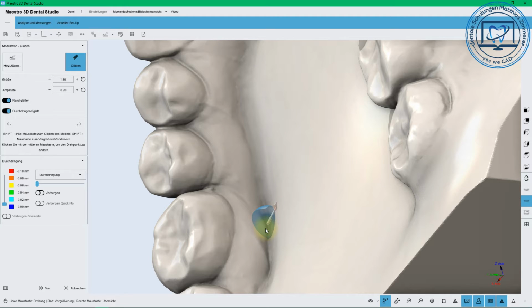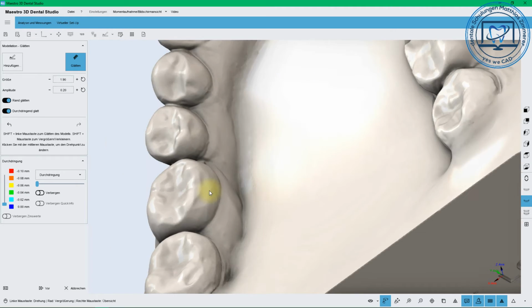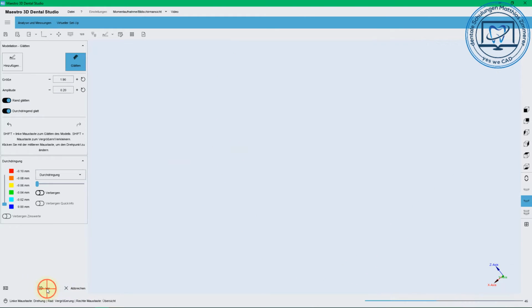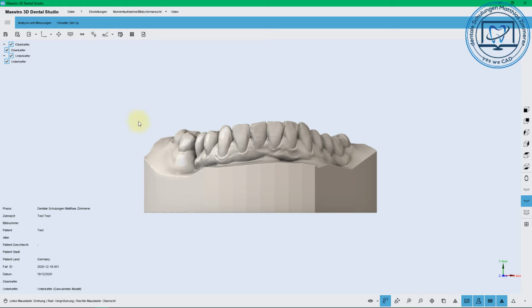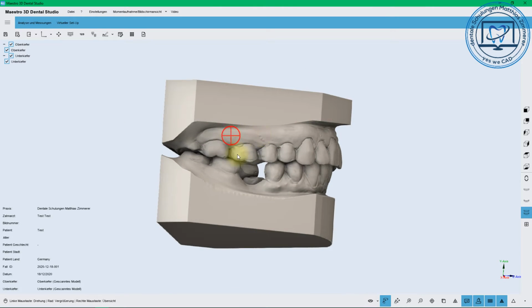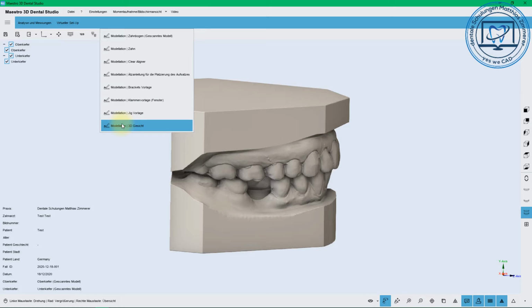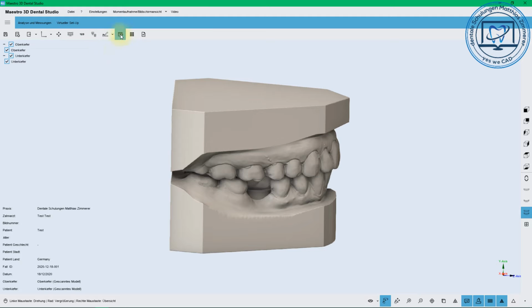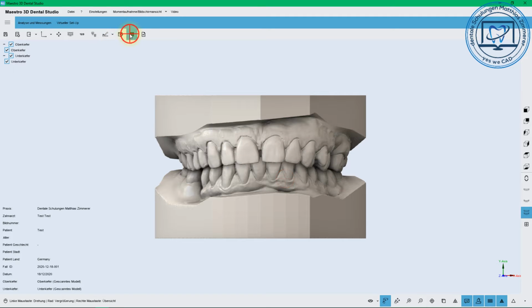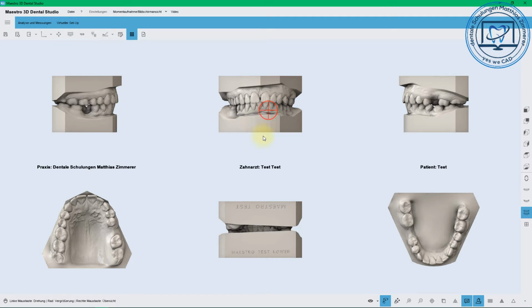It could be a little bit more powerful, I would say normally, but we don't freeform complete models. It's not necessary normally. Just little spots, sharp edges, such things are needed, not the whole model. There you can give some input, which would also be printed on the report.